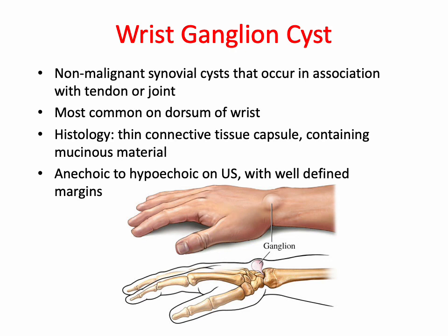They can be classified based on their relation to bones or joints, so whether they're within bone, adjacent to, away from bone, or whether they're within or adjacent to a joint. On ultrasound, the vast majority are hypoechoic or anechoic with very well-defined margins, though some have internal septations and acoustic enhancement. On MRI they are usually seen as a rounded or lobular fluid signal mass adjacent to a joint or a tendon sheath.